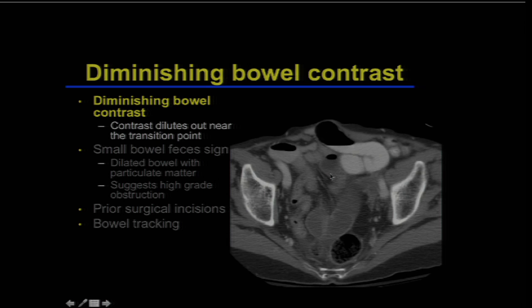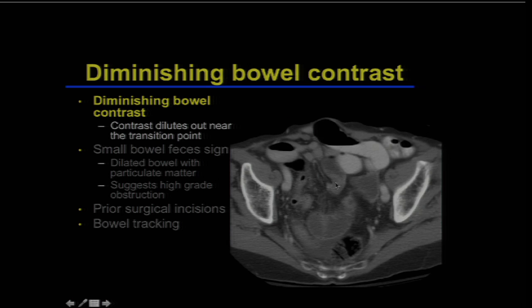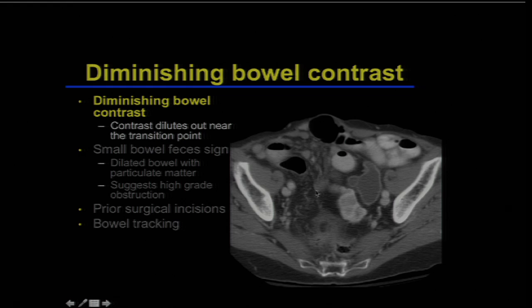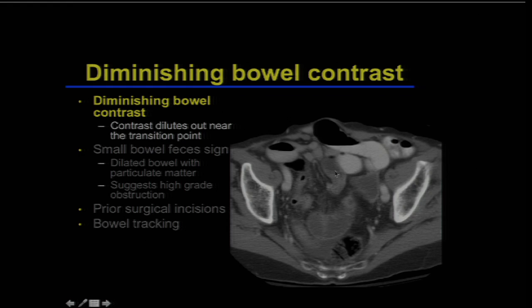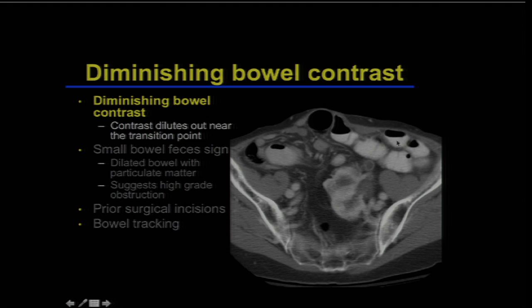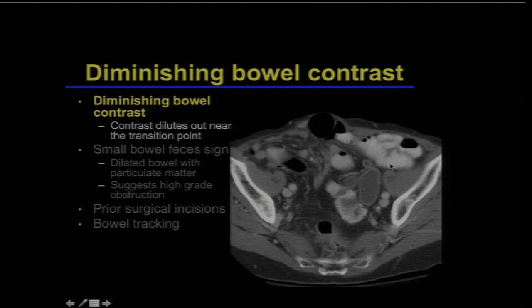And is it any surprise that right at this point, there's an area of hyperenhancement, a beak-like appearance of narrowing and a transition point past which the bowel is decompressed. So looking for the dilution of the contrast agent helps you very quickly find the transition point, even though there were many, many, many segments of dilated bowel, and it's quite helpful for that reason.